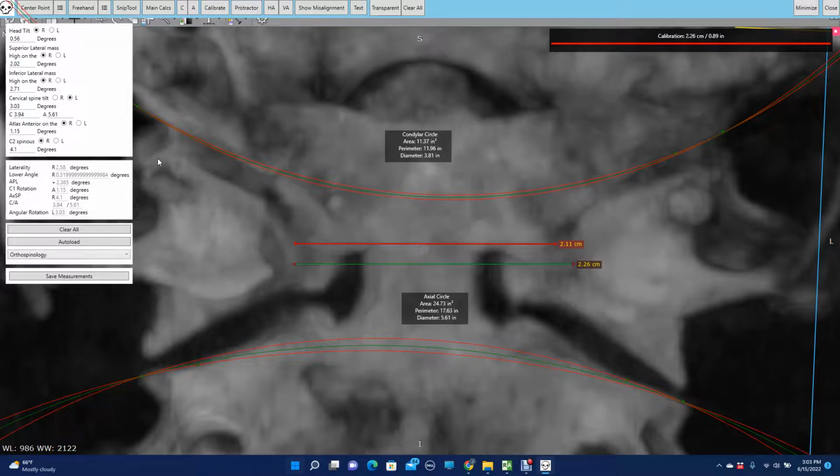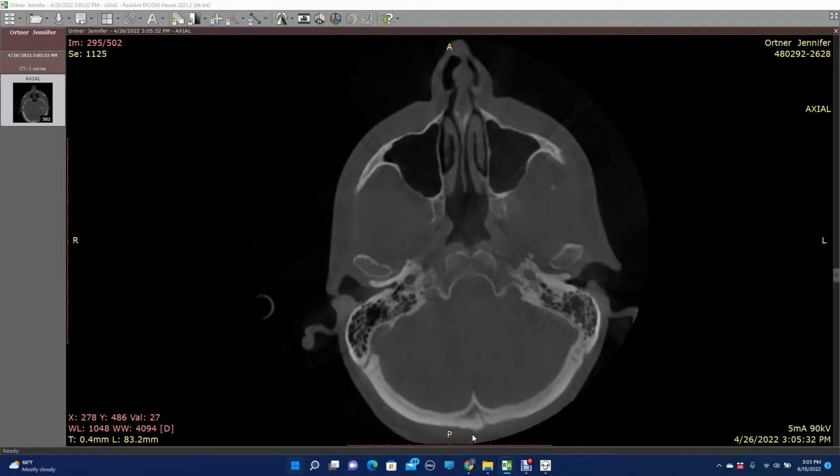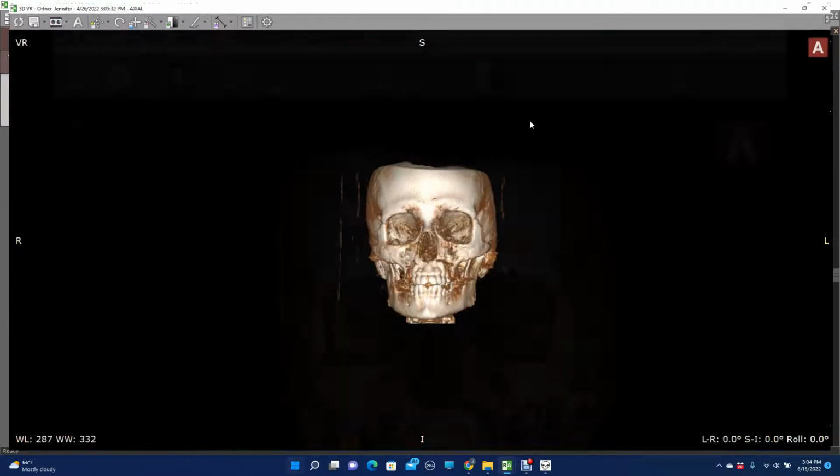That is how we get all of the measurements with this tool. But we're not quite done. We still need to know where we aim the machine, and I like to get a good picture for my report of findings. So when we come back to basic radiant, we can also open up the whole cone beam as a 3D file.